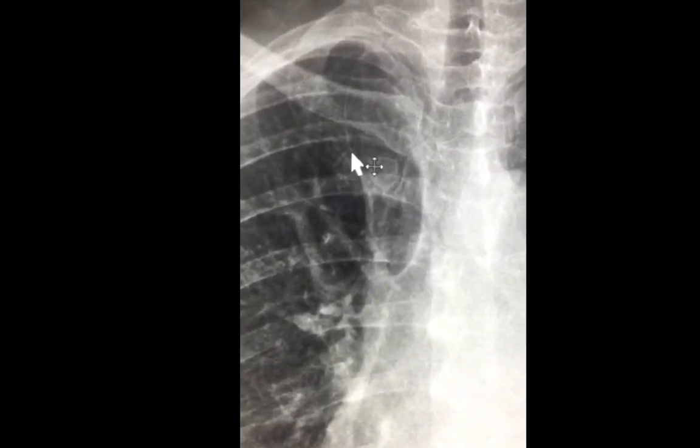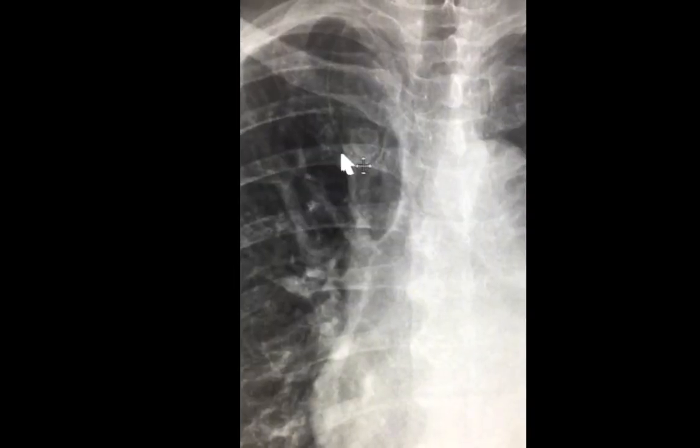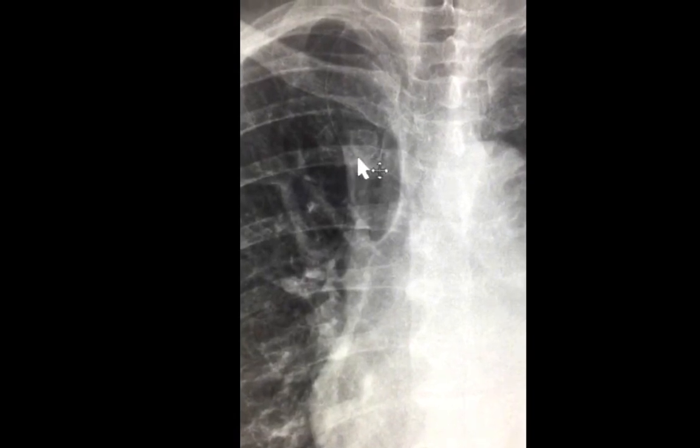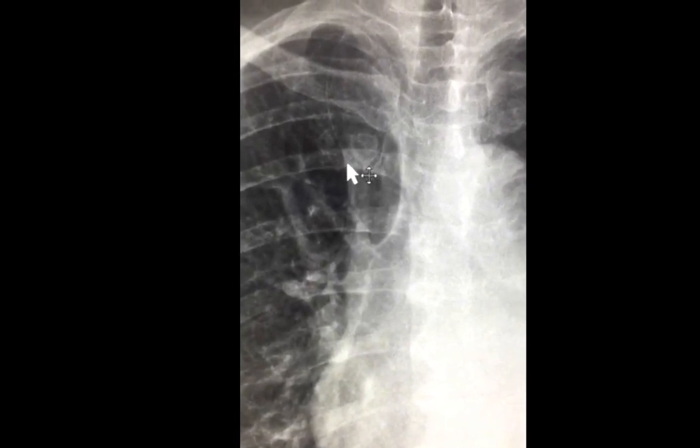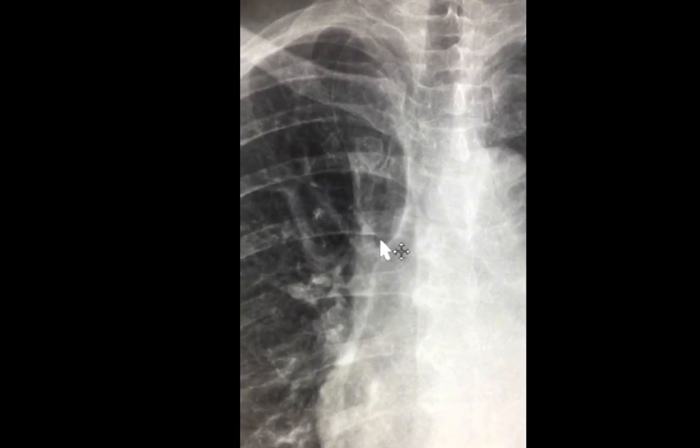Notice that this is the only fissure in the lung that contains 4 layers. By the way, the thickened portion of the lower aspect of this fissure is actually the azygos vein that did not complete its descent to its normal location.